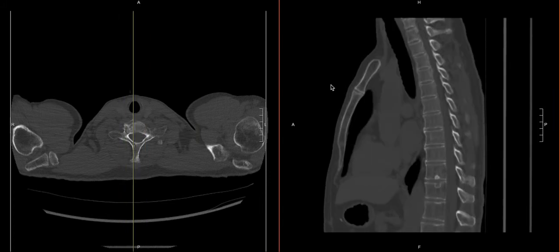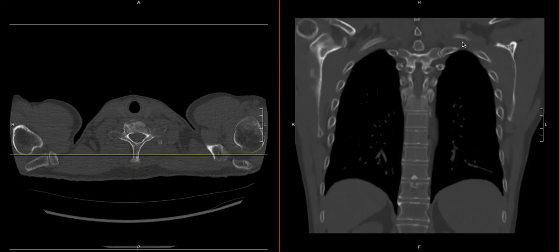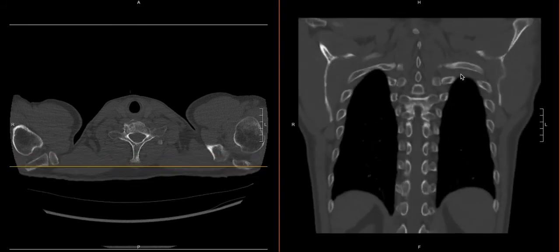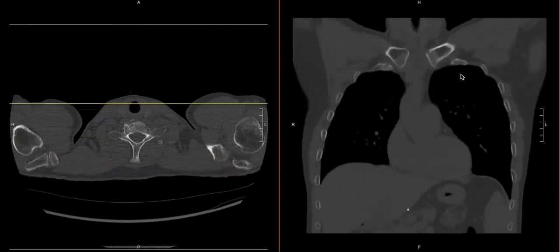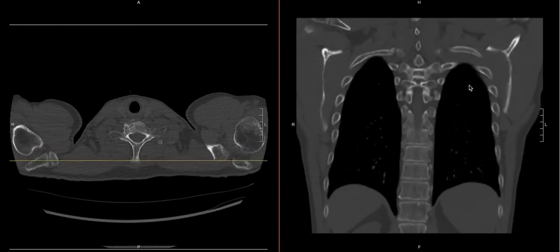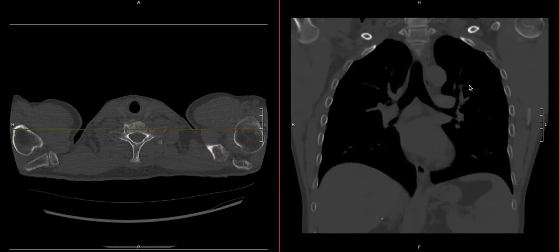And when we feel good about looking through the sagittal and we're comfortable with the alignment, we can just go quickly to the coronal view. And this can give you some helpful orientation with looking at kind of the alignment of the spine in this dimension. Kind of scroll through, again, looking for pathology, any gross malalignment.